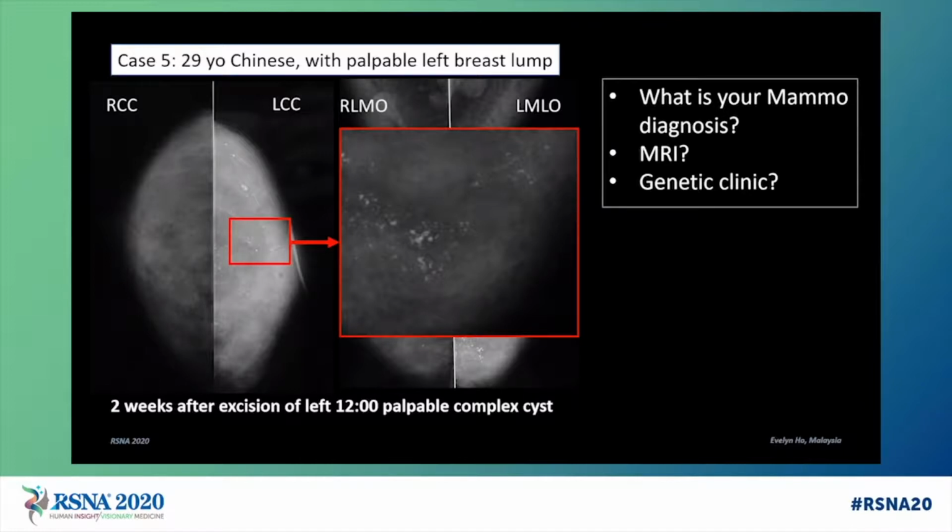Obviously, the histology resulted in the need for these mammograms. Both were surprised with biopsy results, which was IDC with DCIS. Would MRI be of any use at this stage? It would not add information to the left side, but perhaps the right. Today, there is the option of contrast-enhanced mammograms, a cheaper, faster evaluation.